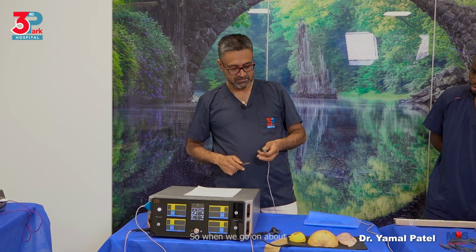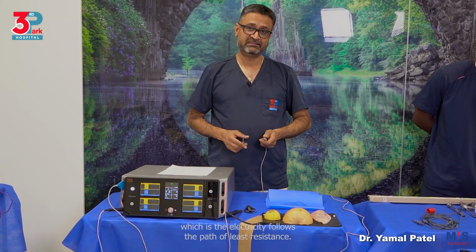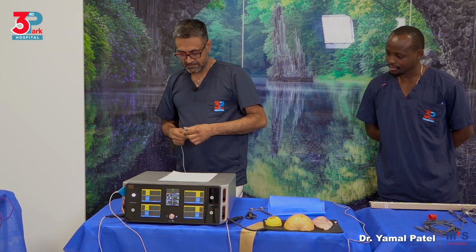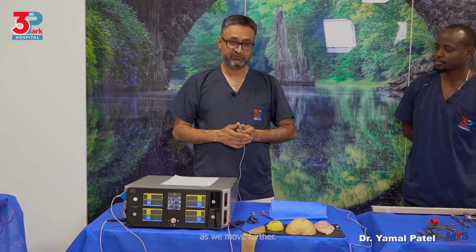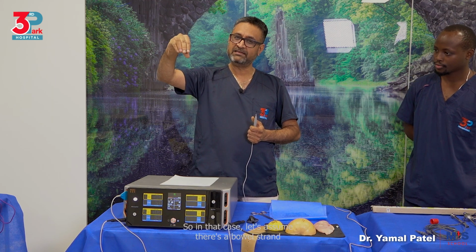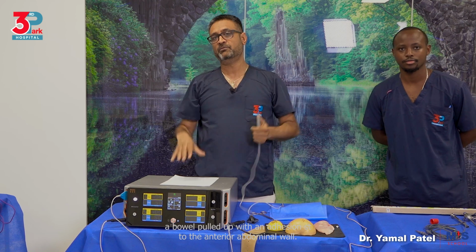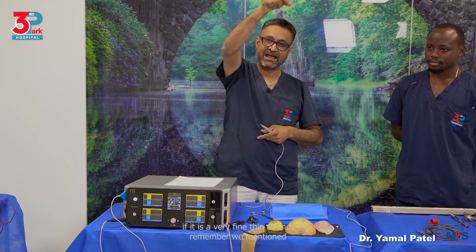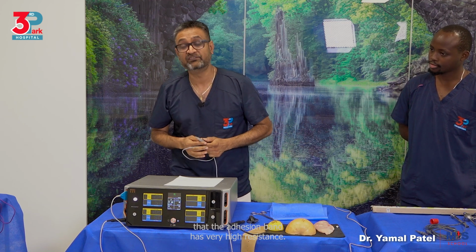So when we go on about the ohms, there is something about Ohm's law, which is that electricity follows the path of least resistance. So when we have, for example, an abdomen which has previous scars and adhesions, just to give you an example, these are practical scenarios I'm going to give you as we move further. Let's assume there is a bowel pulled up with an adhesion strand to the anterior abdominal wall. When you're trying to cut that strand, if it is a very fine, thin strand, remember we mentioned that the adhesion band has very high resistance.